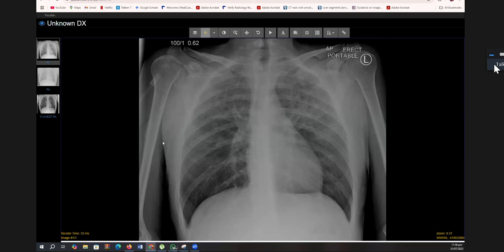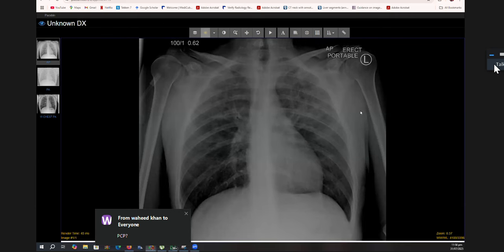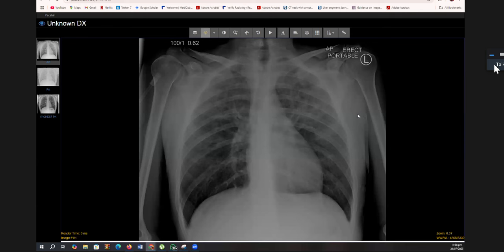Okay, sir. So this is the chest X-ray frontal projection of a skeletally mature patient, in which I can appreciate that there are airspace opacifications which are predominantly noted along the bilateral upper lung zones. Sir, I'll window it a bit. Okay, so the mid and the low lung zones are unremarkable, and the CP angles are sharp. I would now take a look at the rest of the bones and the soft tissues, which are also unremarkable.